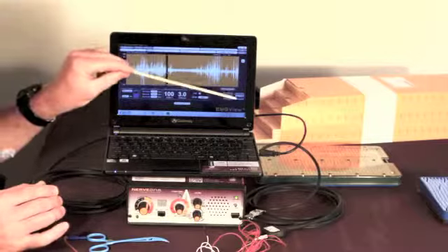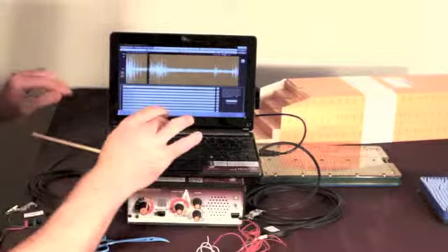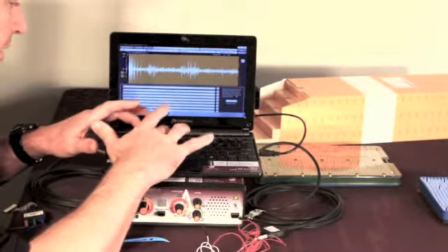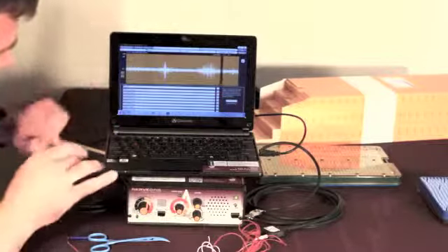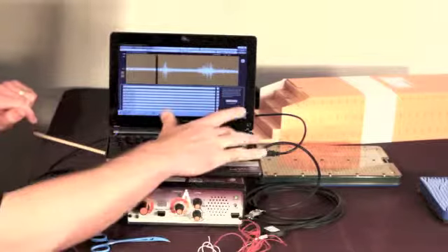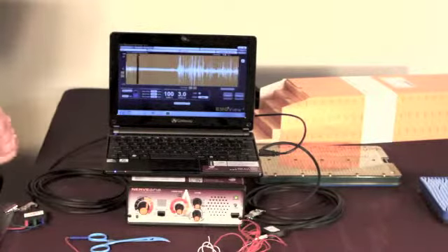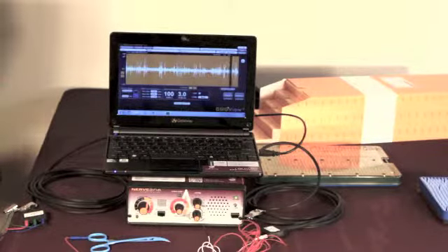Additionally, if I want to place a comment and say, for example, that I did a test stim, I type the note in there, hit the return key or enter, and that comment has now been recorded in my playback file that I am recording here on EMGView software.